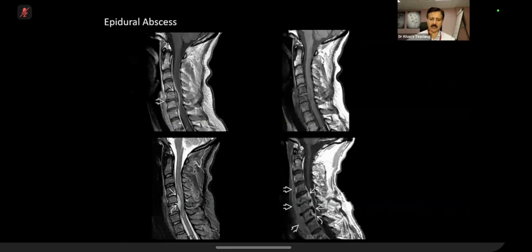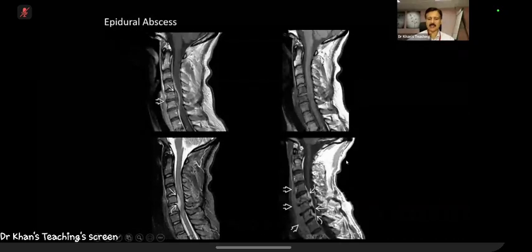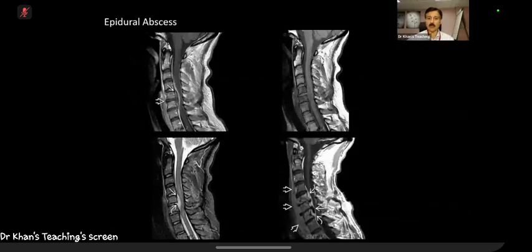And here comes the same point from STAT DX. You see here, all of this, the dura is enhancing, there is a bit of phlegmon. Within that, if this was a T2, this portion here, which is not enhancing, you will call that portion an abscess, because the clinician will ask how big it is. Then you can measure this component. Don't measure everything else. When you do a rescan, it might enlarge in size because it might liquefy. On the other hand, because of antibiotics, it might reduce in size.